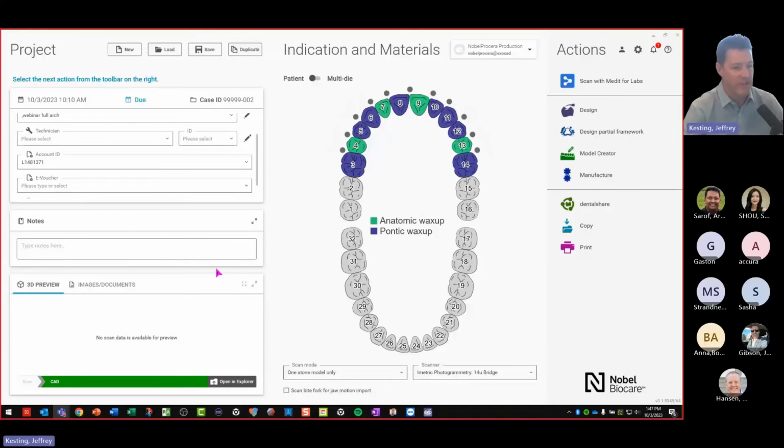Hey, Josh, no, there's not. So you can just contour that to your model, to your ridge. And like I did, you could go in and then just freeform. So there isn't anything stock there for design, but that'll adapt to your jaw there. And then you can relieve that to whatever you need to.